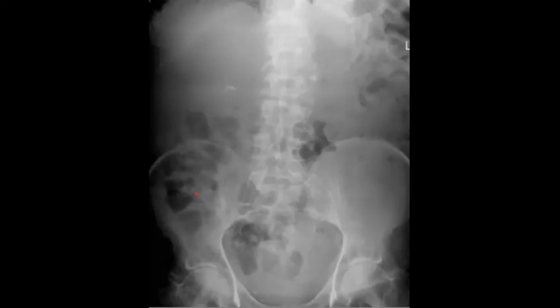Nice, Huda. Ala, you mentioned that maybe this calcification, as we know this is the site of the pancreas, could be calcification of the pancreas, denoting that it can be chronic pancreatitis. And these clips could be cholecystectomy clips.